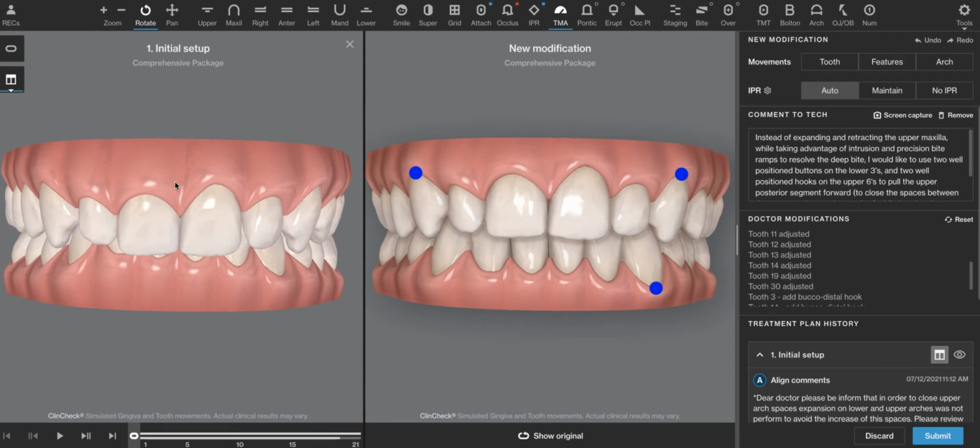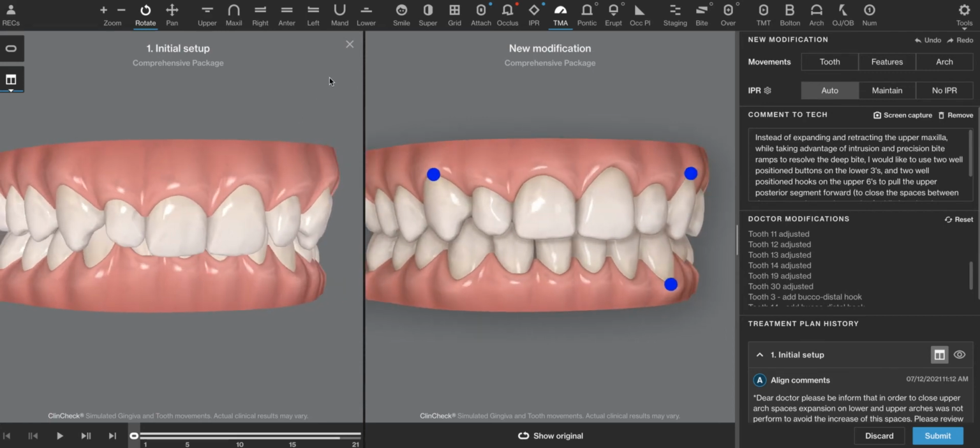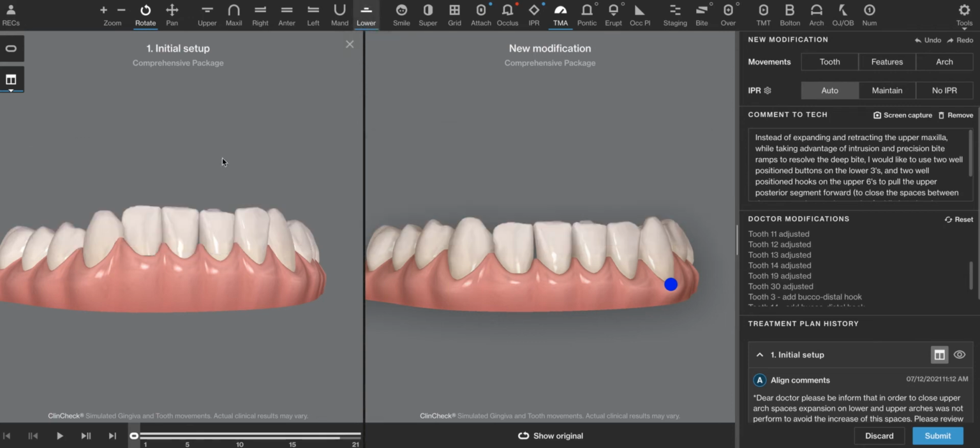Yes, minor surgical intervention here on number 8 is possible because of the delayed passive eruption. That's not necessarily going to solve the problem of the deep bite. But what we're more likely to see is probably 50% deep bite when we're done, just based on experience.